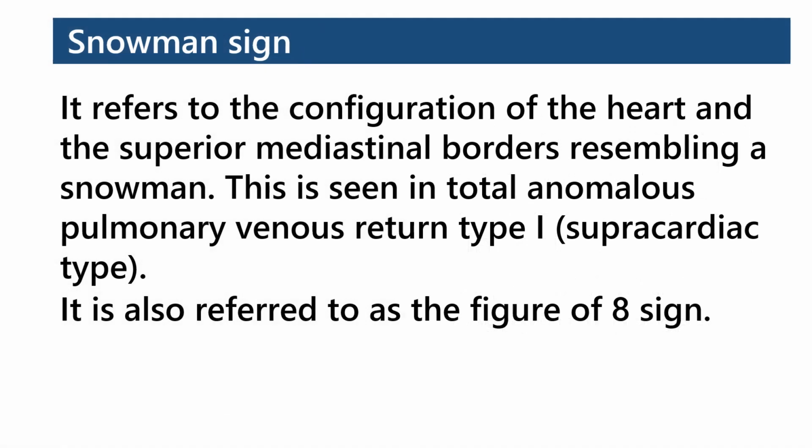Snowman sign refers to the configuration of the heart and the superior mediastinal borders resembling a snowman. This is seen in total anomalous pulmonary venous return type 1 or supracardiac type. It is also referred to as the figure of 8 sign.